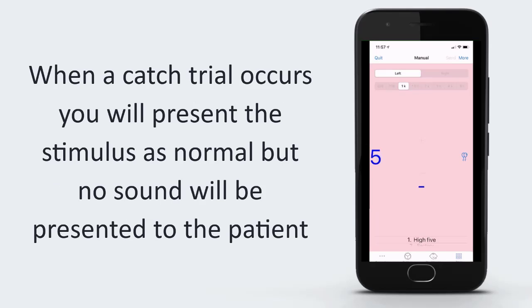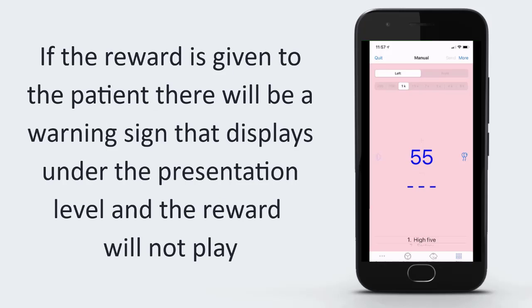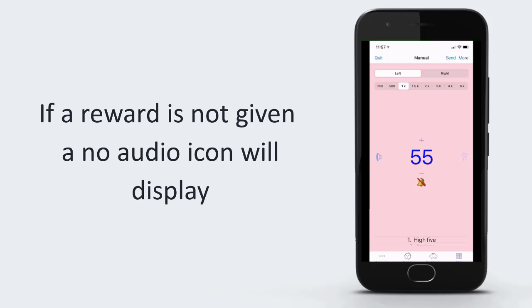When a catch trial occurs, you will present the stimulus as normal, but no sound will be presented to the patient. If a reward is given to the patient, there will be a warning sign that displays under the presentation level, and the reward will not play. If a reward is not given, a no audio icon will display.